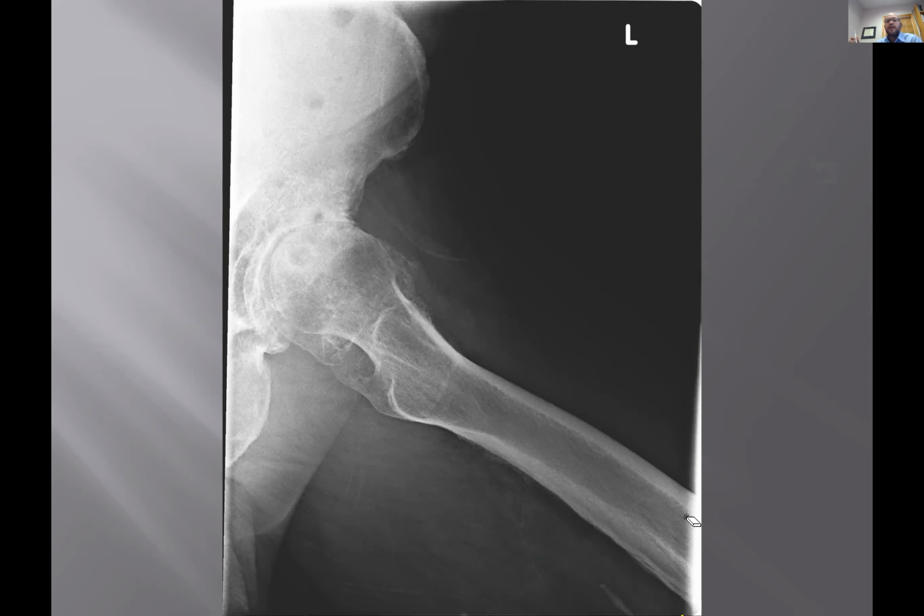And again, we've got plenty of findings in the bone, plenty of findings in the joint, but we don't want to get search satisfaction. There's another finding in the soft tissue. So we always go technical, alignment, bone, cartilage, and soft tissue. We don't stop. We don't get search satisfaction. We look all the way through the soft tissues, and now we see some of that.